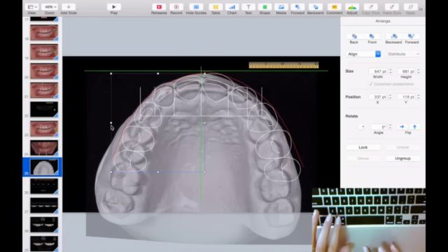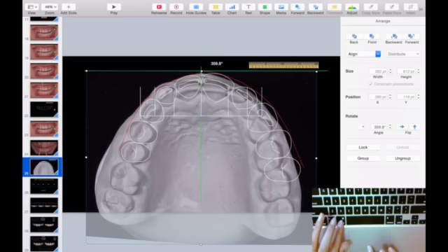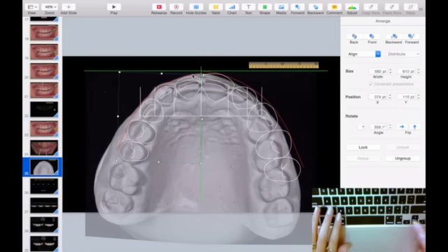And you place them first on your proportions ruler. Make sure it's the right size. You tilt this a bit and you place it in the right spot.